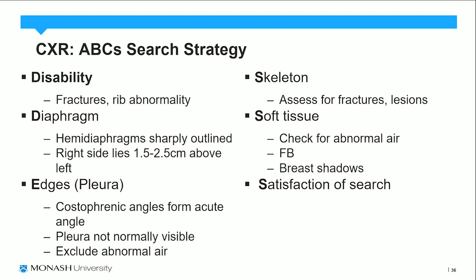And then finally, the chest has got a lot of stuff in it, so ensure that you do the satisfaction of search so that you don't miss out on any important pathology.